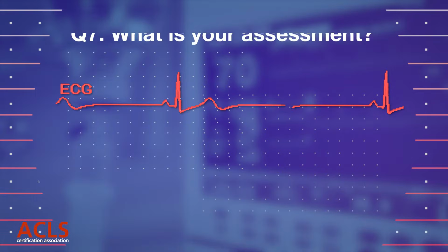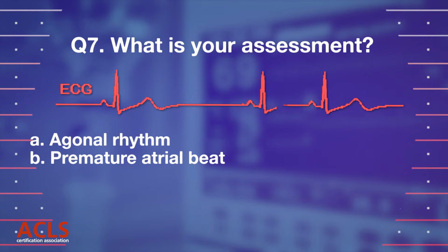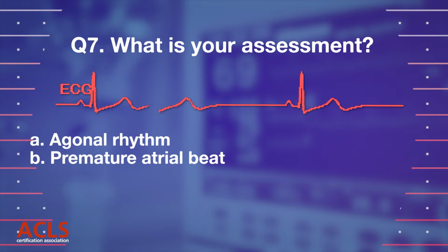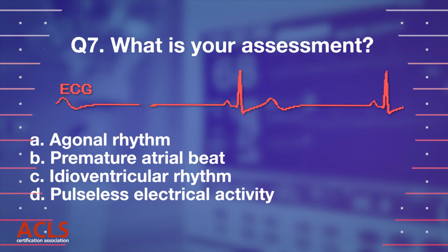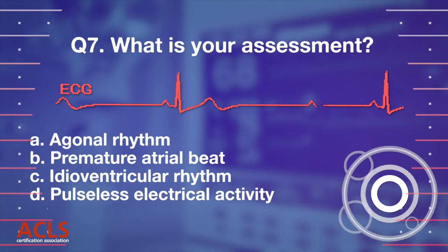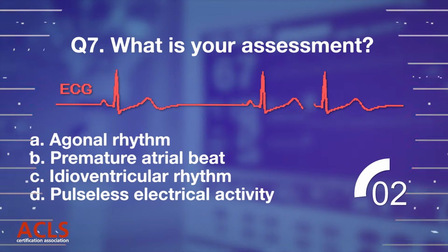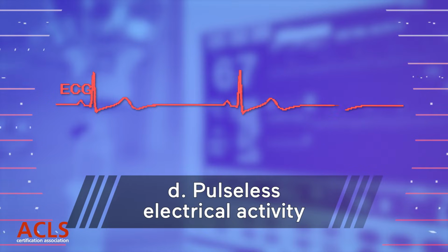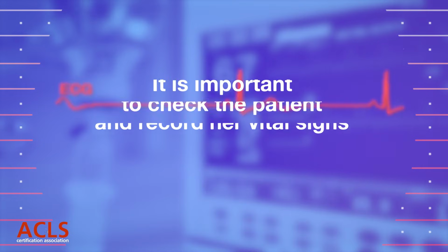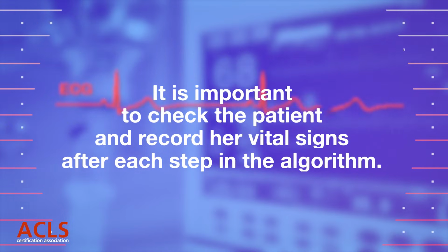Question 7. What is your assessment? A. Agonal rhythm. B. Premature atrial beat. C. Idioventricular rhythm. D. Pulseless electrical activity. Correct answer, D. Pulseless electrical activity. It is important to check the patient and record her vital signs after each step in the algorithm.